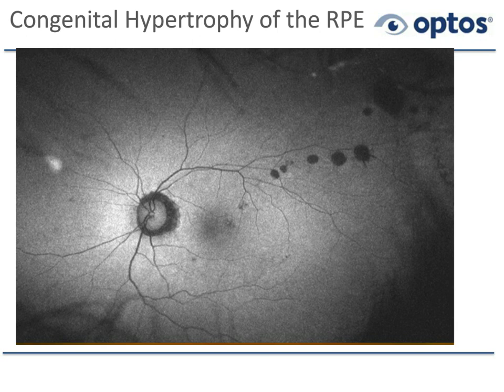About 10% of eyes, somewhere between 9 and 11% of eyes, have CHRPE lesions, and the same number have nevi. And of course, they're going to look different. The nevi will disappear on autofluorescence, and the CHRPE lesions will show up as dark lesions, as we can see here.